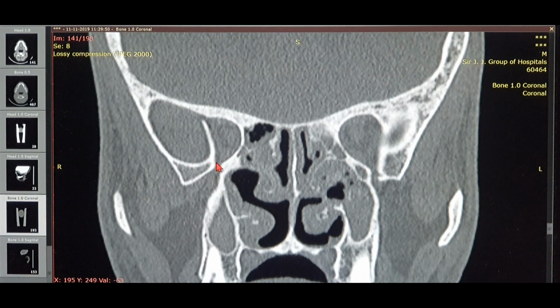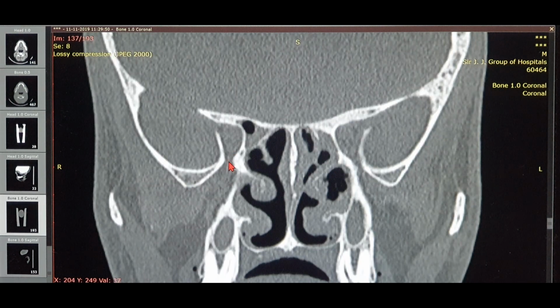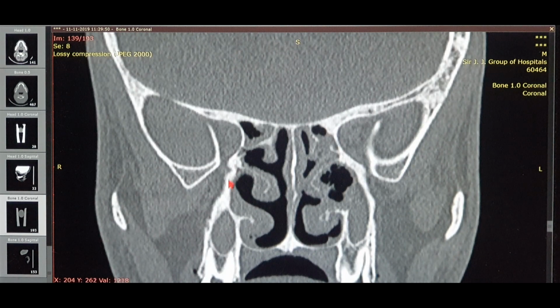This is the inferior orbital fissure. Keep going behind. This is the entire inferior orbital fissure, or you can say the foramen. Mostly it's called the IOF, the inferior orbital fissure actually. So you just keep on following it, and there you see the bony opening. See, all this time there was a vertical bone. This is nothing but the perpendicular plate of the palatine bone.